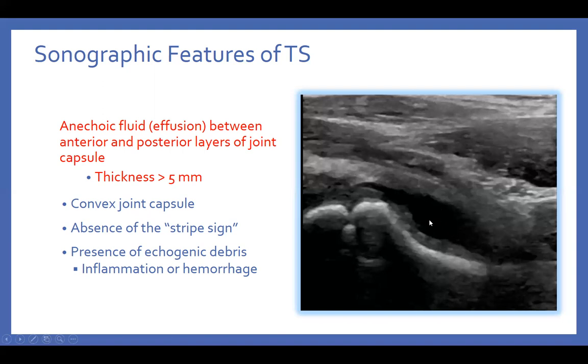It could be septic arthritis or a septic hip without debris in there. So the idea is you have to mention what you see in that effusion. It shouldn't be that bad. Once you know your normal anatomy and the technique, anything outside normal, you'll pick it up.